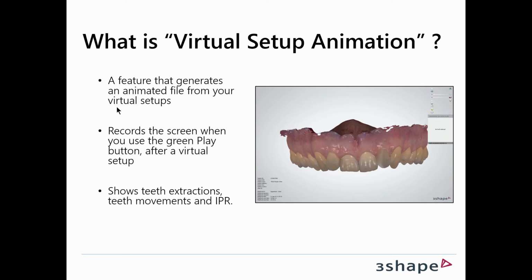So what is Virtual Setup Animation? Well, it's a feature that generates an animated file from your virtual setups, as you can see here on the right side of my screen. It records the screen when you use the green play button in the virtual setup, and it shows teeth extractions, teeth movements, and IPR slicing.